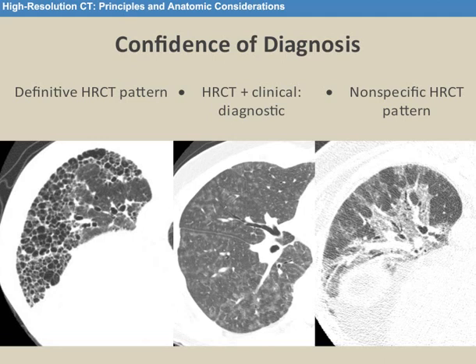Number 2 is, like I just showed you, a combination of this basic clinical information plus the CT together make a diagnosis, almost definitively without pathology. And then lastly, there are cases where you just have to throw up your hands and say, here's some patchy ground glass, maybe a little bit of reticulation. Patient, I don't know what the patient has. The CT is totally non-diagnostic. You need pathology and clinical information in this case. Those are what drives diagnosis.